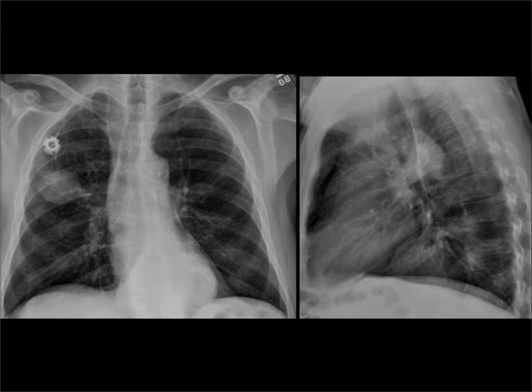And I'll show you. So here's an example. This is a patient. Now they've got a big old fat lung cancer, but ignore that. Here's the azygoesophageal line, and whoop, it swings over to the right. And the reason it swings over to the right is because the patient has this big hiatal hernia sitting here. Here it is sitting behind the heart on the lateral study.